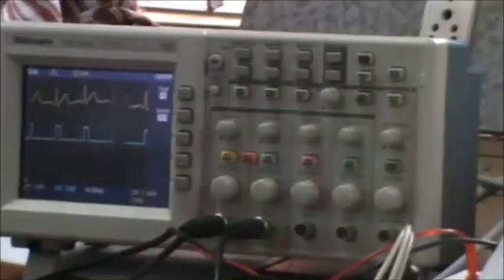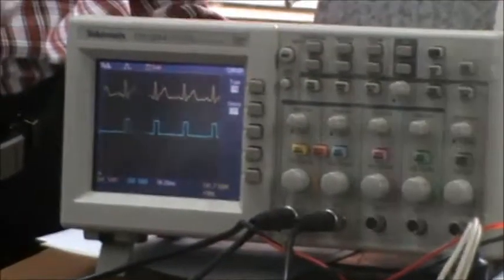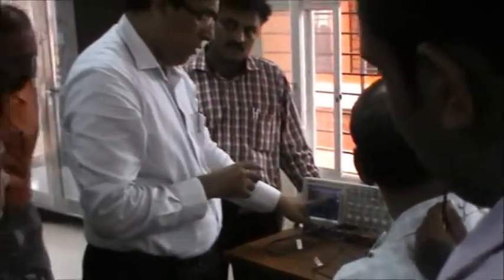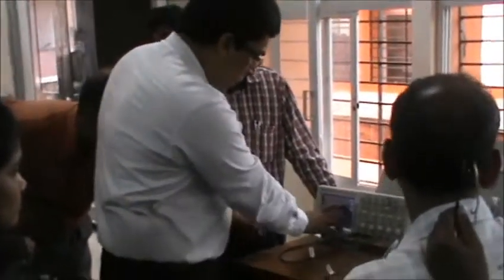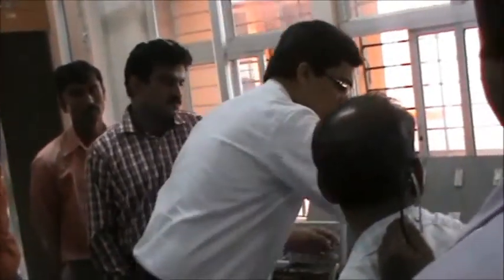Now what we are going to do is convert this frequency into voltage. So we add a frequency to voltage converter block. The detector output, we sync it with that, exactly at the rising edge of the QRS. So it has to have a synchronization with the rising edge of the QRS. So that is what we take as a reference.